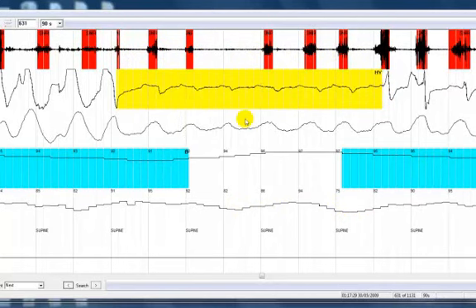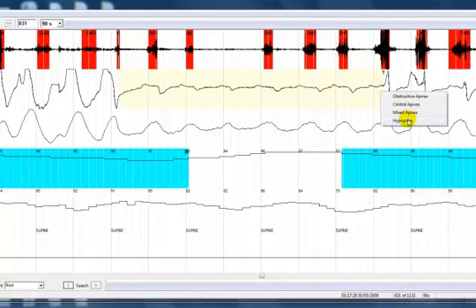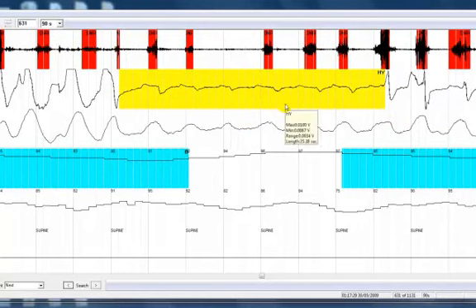Now that we've discussed both apneas and hypopneas, let's take a look at how you might actually want to score an event. First, I'll remove this event by right-clicking and selecting Remove Event. Next, I'll left-click, drag to the right, and then release. I'll select hypopnea. This is how one would score an event. However, the MediByte JR software is very reliable in its scoring.